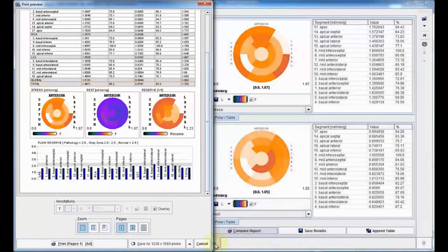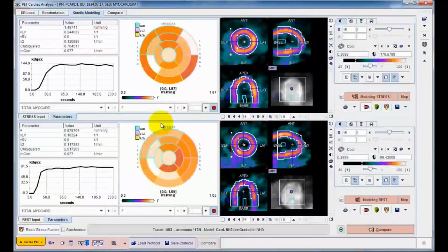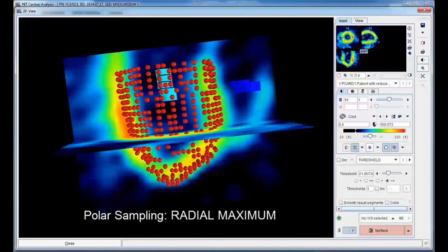The various procedures involved in cardiac quantification are complex and may sometimes need manual intervention. Our tool therefore offers many ways to investigate data processing. The data sampling for creation of the segmental uptake curves is a crucial point. Investigation of this data sampling is supported by an interactive 3D rendering, which shows each sampling point as a red dot, together with orthogonal slice images. As can easily be seen, the sampling points correspond to the locations of maximal wall uptake.